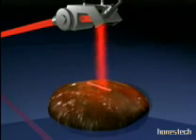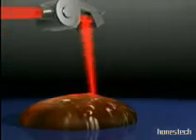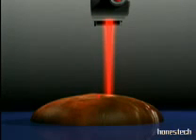The software calculated penetration depth is in fact based on the average absorption of the CO2 laser by living soft tissue. Depending on the desired length and penetration, the software calculates the required power and pulse duration for the single pulse mode. Both pulsed and continuous modes are available.